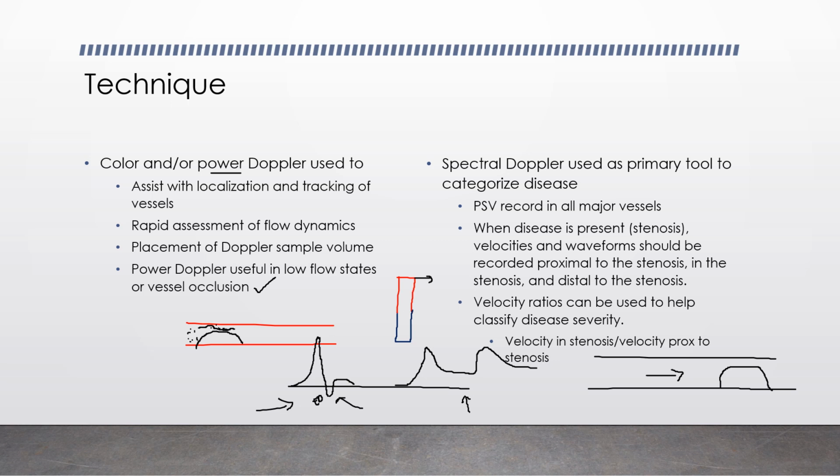So you can see things which will occur where you're seeing an even farther drop below baseline, and once the Windkessel effect kicks in, that's not enough pressure, it's not strong enough to get it above the baseline like we see here. And so you would just have what we call a biphasic flow, a systolic upstroke, but early diastolic flow that stays below the line until the whole next systole. Okay, so that could be increased in our stenosis.